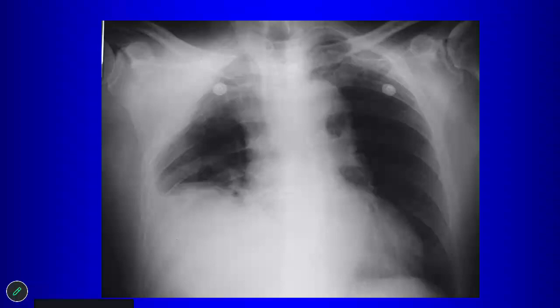I think there's probably some underlying atelectasis, from restriction of the lung. I guess it could just be a very large pleural effusion. That's a possibility, that you have a large pleural effusion with passive atelectasis, but that doesn't feel right. Anybody else have any other thoughts?